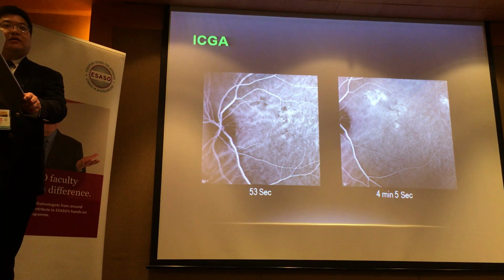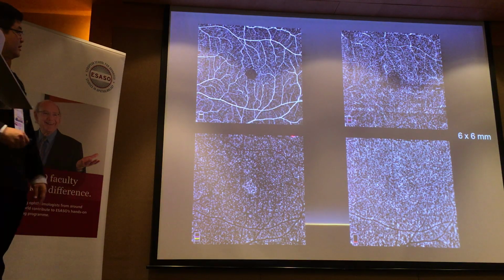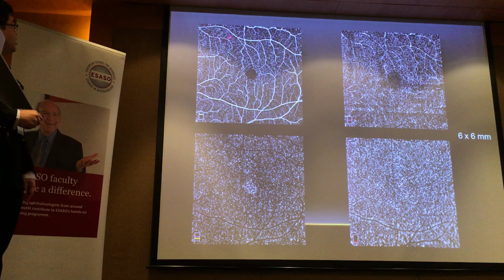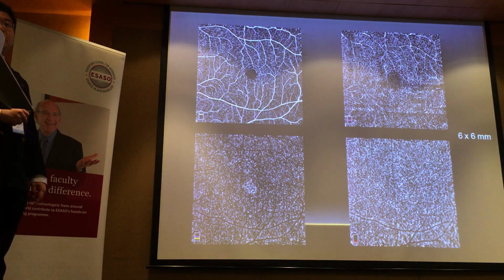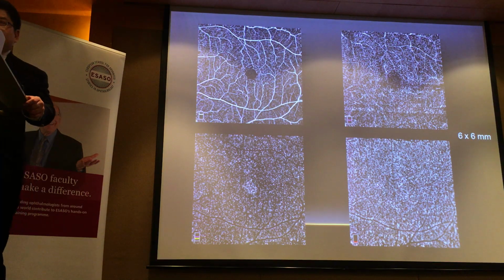But is it an early, small CNV lesion? Do we need to be concerned? Well, this is the OCT angiogram. But remember, I told you, this is a 6x6 millimeter scan. The region is probably a bit up there. You might see part of it, but not all.